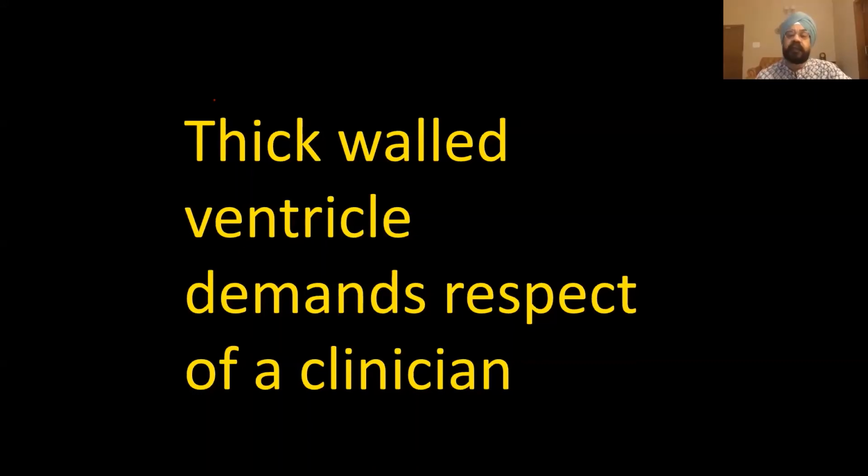Now, the question is about the myocardial crypts. Do they have any significance like we have significance to the LV aneurysm, hypertrophic cardiomyopathy, or otherwise? So myocardial crypts actually are nothing but blood-filled spaces lined by trabeculae. They are more common in hypertrophic cardiomyopathy, but they are also seen in hypertensive heart disease. They are also seen even in normal individuals. Statistically, they are more common, but that makes them sensitive but not specific.